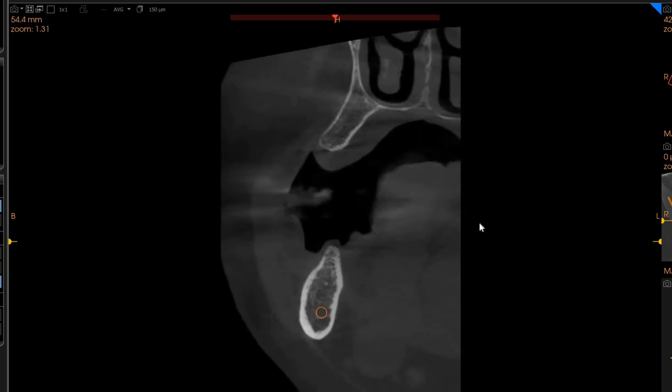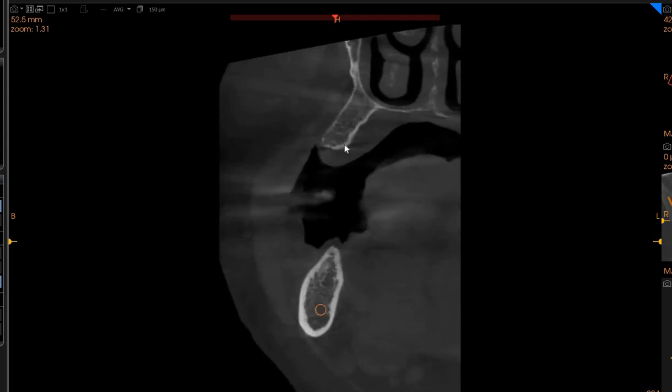This is the region distal to the upper right 5. So we presume this is the sixth region. This we've got D3 quality bone, ridge width of approximately 6 millimeters and a height of approximately 13 millimeters.